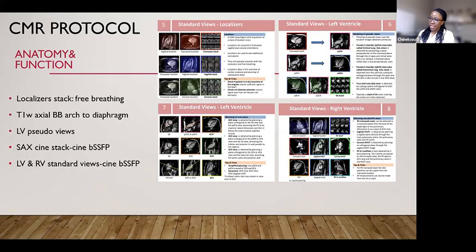So first of all, because it's a cardiac MRI talk, we describe the protocol we need. For these patients, we want to establish their volumes, because getting a robust assessment of cardiovascular volumes gives us a validated and the most accurate assessment of ejection fractions, right and left, as well as atrial volumes and function.